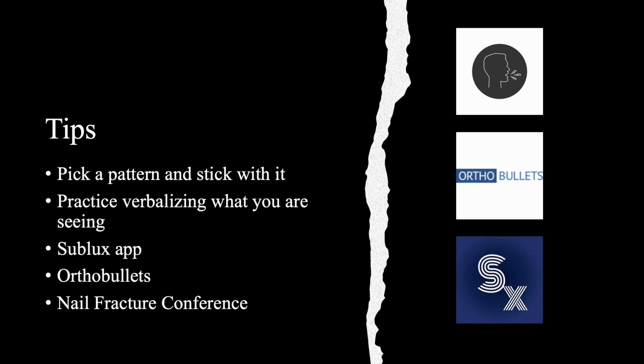Practice verbalizing what you are seeing. It's very easy to look at an X-ray and see what is wrong. However, trying to verbalize what you're seeing so that someone who isn't looking at the X-ray understands is a whole other thing. So as we move along through this, for what to include in your interpretation and how to present the X-ray, anytime you see an X-ray, practice verbalizing it out loud. It will help a lot, just in the basics of how to get across what you're seeing to another person.